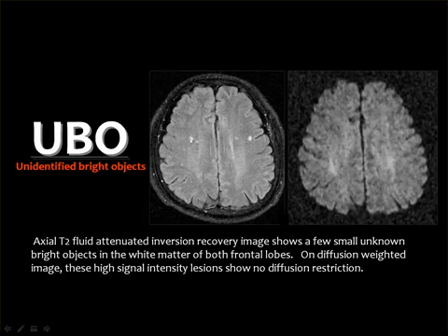These are examples of unidentified bright objects, and the lesions are not showing diffusion restriction.